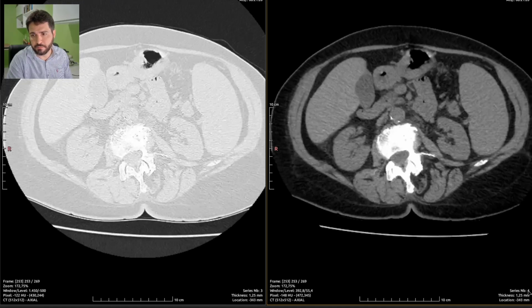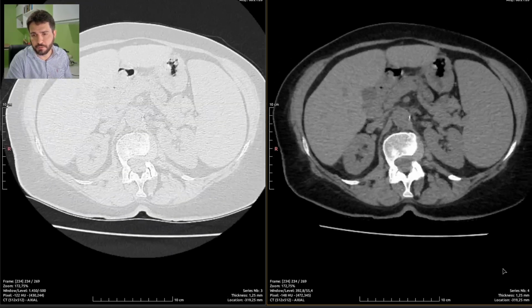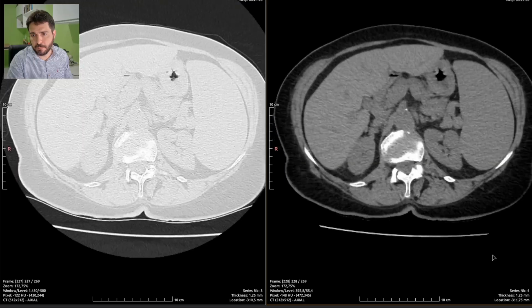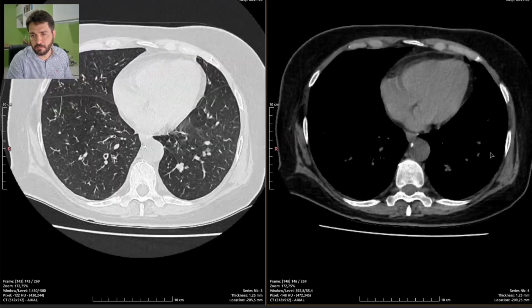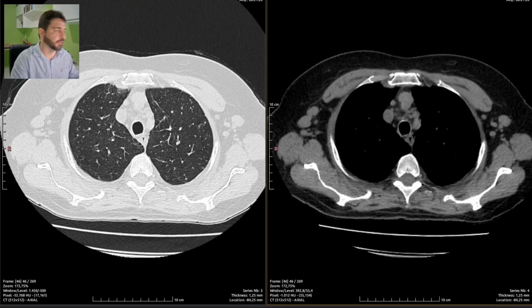The spleen is really enlarged, at least moderate enlargement of the spleen, which is completely incompatible with a 80-year-old female patient, no matter the complaints.